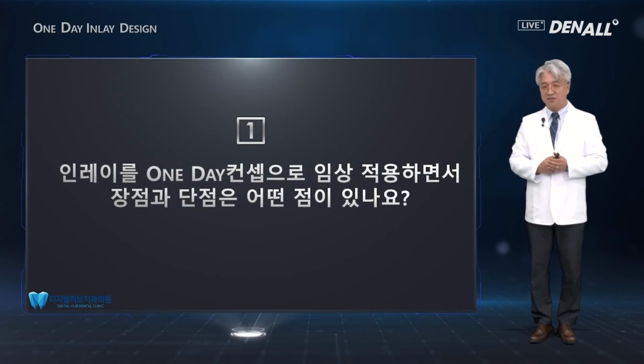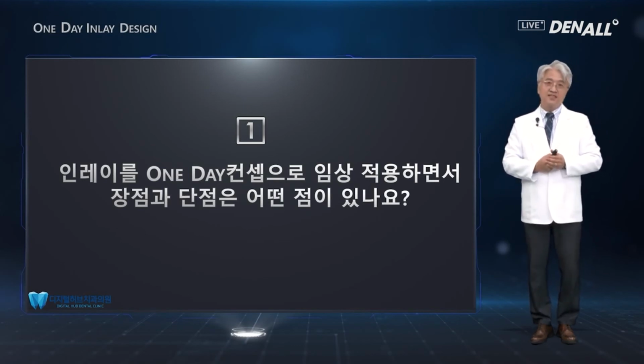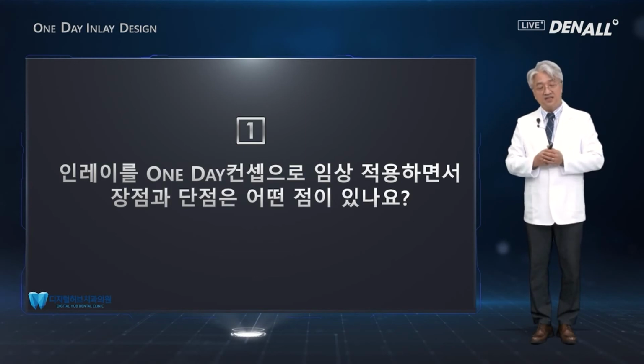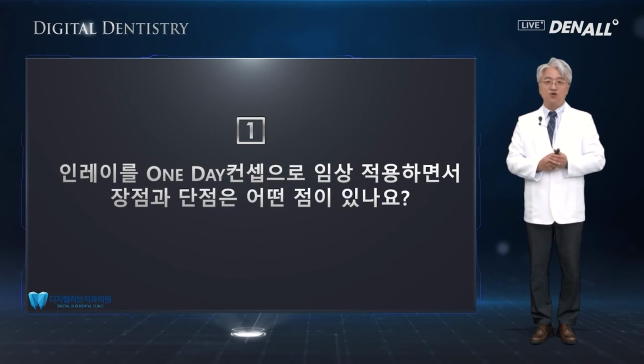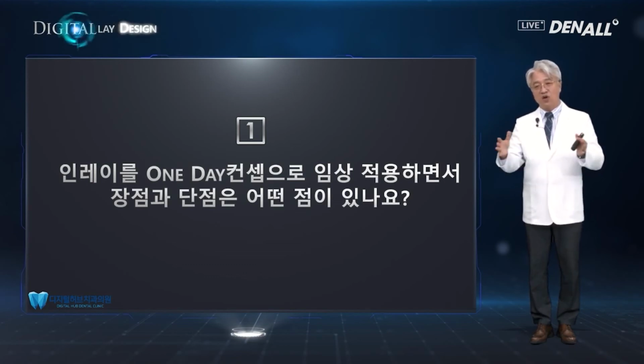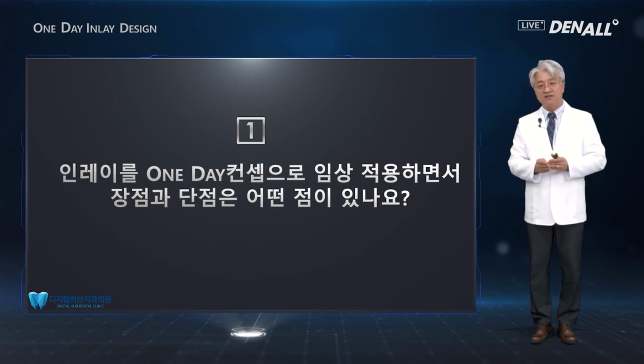But what are the disadvantages? First, with the resin printer or the milling machine, when you use all-ceramic or hybrid resin, there's room for improvement in the strength of these materials. Secondly, if you make an inlay with CAD/CAM, you now need devices that you didn't need before, like a milling device, scanners, or design software.